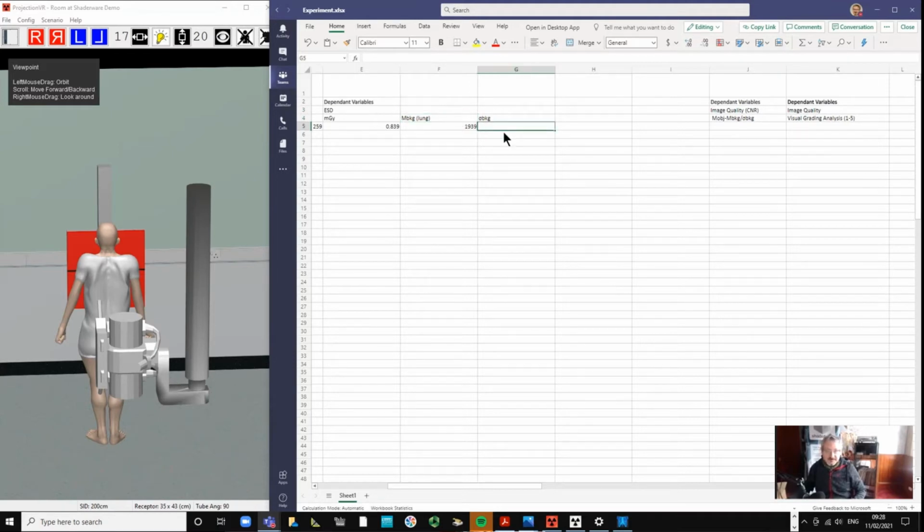So standard deviation background, please. Was that 69? Someone confirm? 69, yeah. Perfect. That's why we need more. Teamwork makes the dream work. Right, obj. The object was the rib. 2475. Yeah.